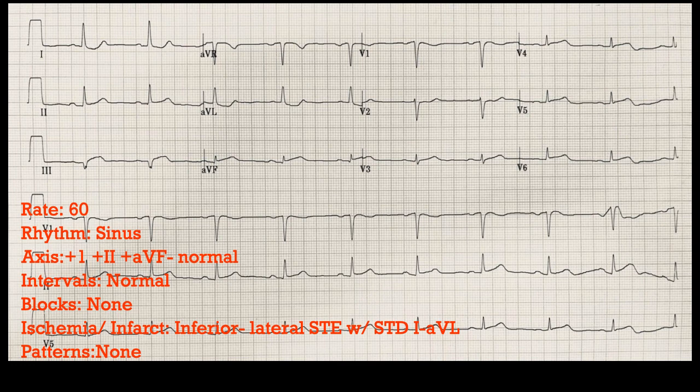Patterns otherwise, I don't see any peaked T waves. I don't see any obvious stuff that just rings a bell to me. So we're going to call this impression inferolateral STEMI.